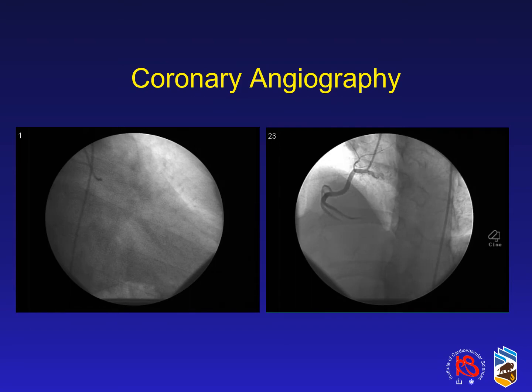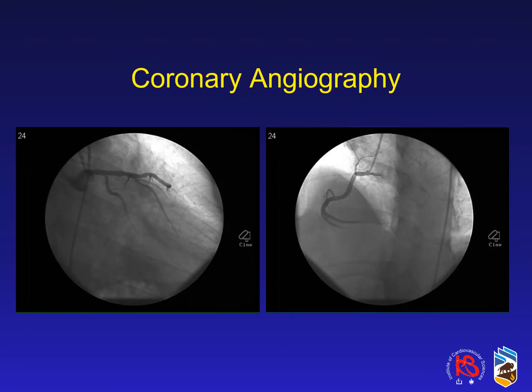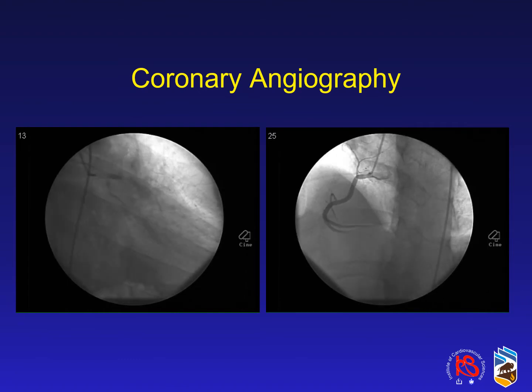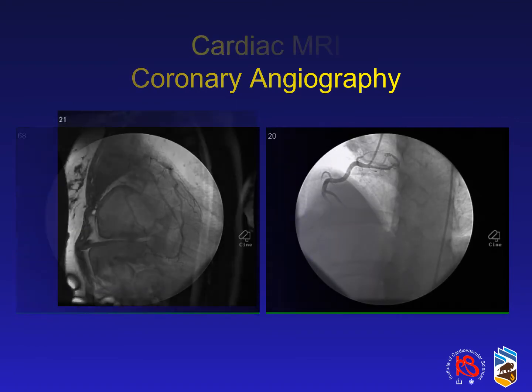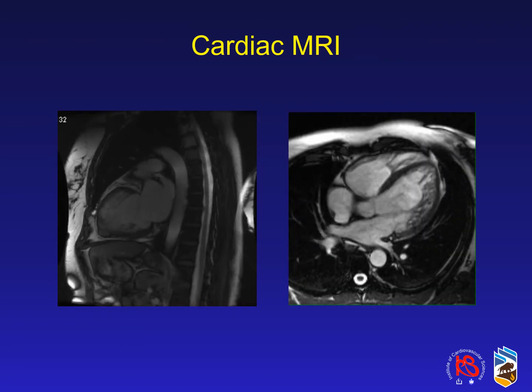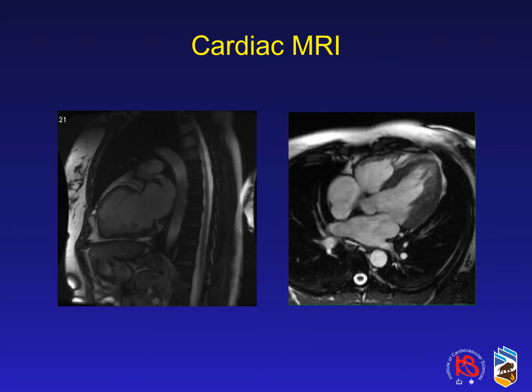As the patient had new symptoms of shortness of breath, a cardiac catheterization was performed which revealed no evidence of obstructive coronary disease involving the left system nor the right coronary artery. And finally, a cardiac MRI was performed which revealed evidence of excessive trabeculations noted towards the LV apex, as can be seen on the current CMR images.